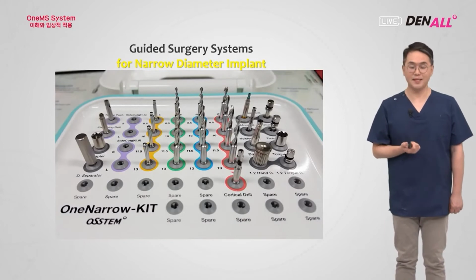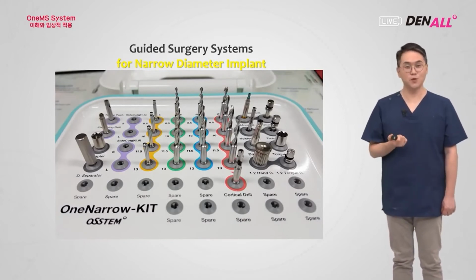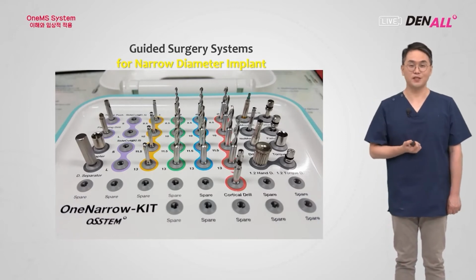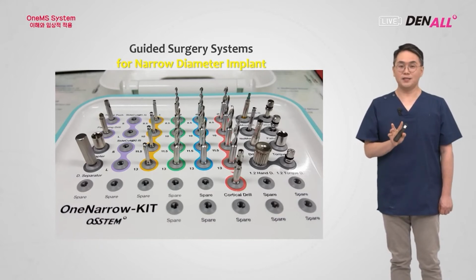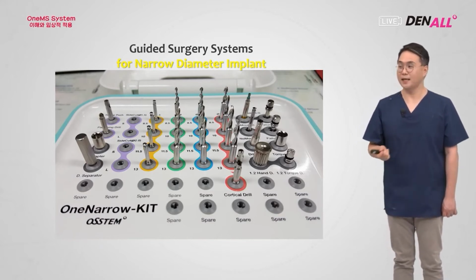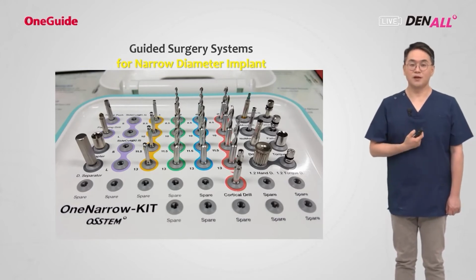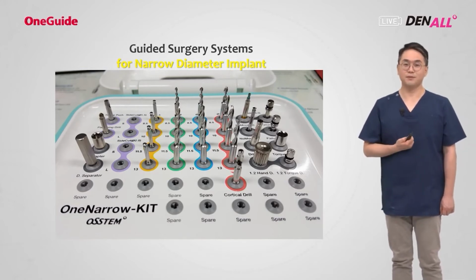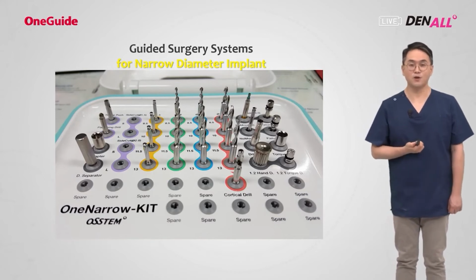It's the OneMS Kit. It was named the One Narrow Kit, but now it's called the OneMS Kit. So on the lower anterior side, if the mesiodistal distance is narrow, or if you want to place a one body implant, then using this OneMS system would be a good option. So let me explain about this OneMS Kit.